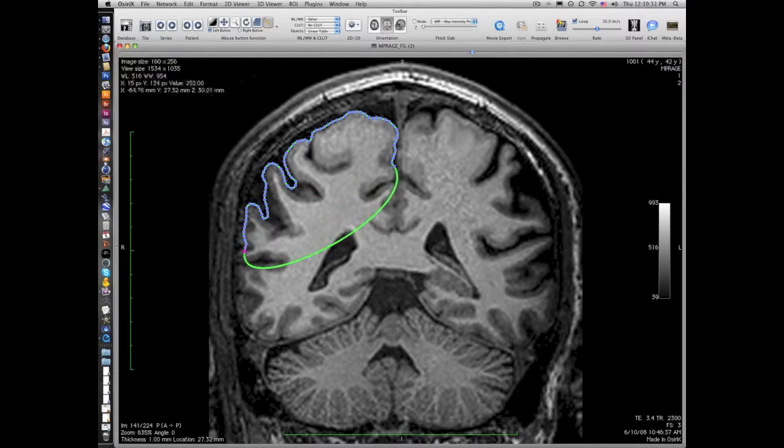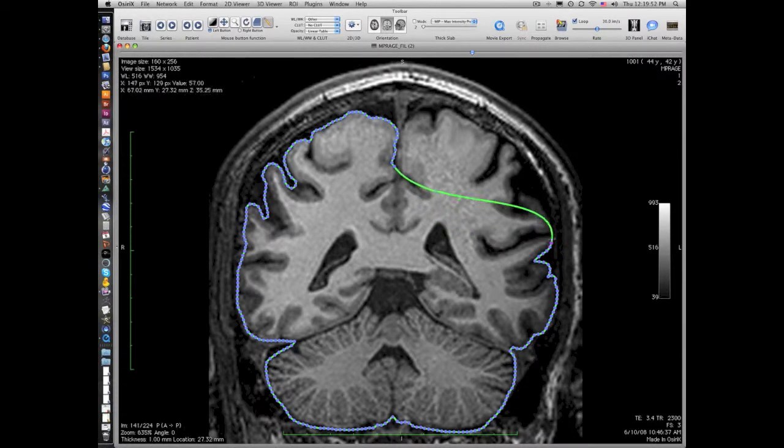One of the things that will help you is to scroll back and forth through the series of slices before you begin this process, so that you're aware of what you want to remove. You think you would know, but very often you get in here and you think, oh gosh, I don't even know, and you have to delete the ROI and start over. You can modify the ROI, but it's almost easier just to redraw it. The tools for modifying it aren't great.